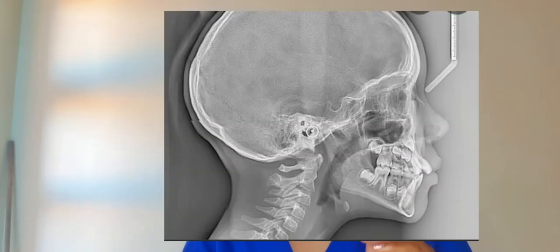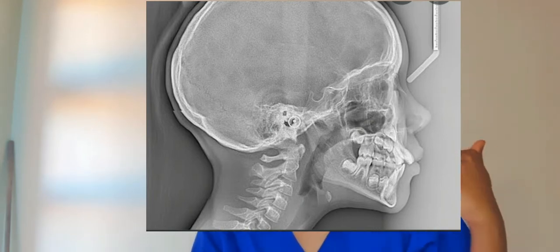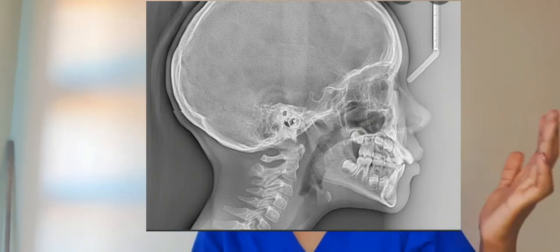So I found one last presentation here. It's about cephalometric tracing methods. Essentially what happens is we take an extraoral full radiograph of the patient. So that is our Ceph x-ray. Then based on that x-ray, digitally, we're going to find landmarks, but I've discussed this in your lecture. We're going to identify specific landmarks that help us map out the patient's skeletal growth and any other skeletal discrepancies. If you cannot do it digitally, normally we put tracing paper on top of our Ceph x-ray and then manually trace it out.